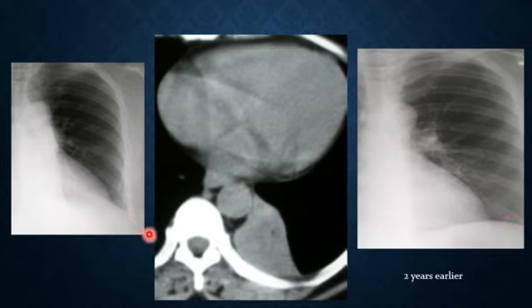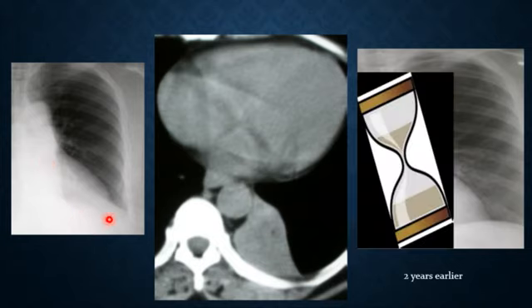And you can see there is no retrocardiac opacity, and now there is. Like here, this waist that was here, it's lost now. Okay, another example.